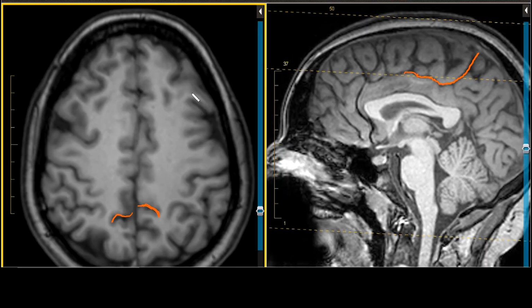Perhaps Salvador Dali's mustache. Now, if we were to look at how we would acquire CT cuts, we would acquire them obliquely like this, that would mean that the marginal sulcus or the pars marginalis kind of has the same position as we go from caudad to craniad in the axial projection.